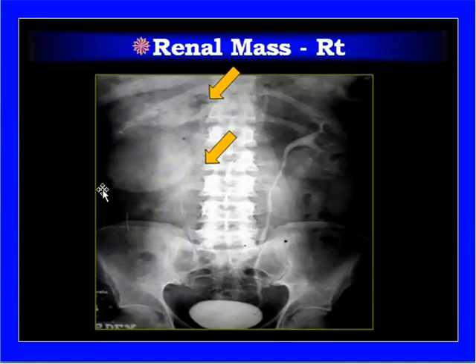Renal mass, intravenous urography has been performed. On the left side, you can see the normal pelvic system with the normal ureter. Urinary bladder is also normal. While you can see a mass on the right side, you can still trace down the right ureter, which means that there is contrast excretion present in the right kidney in spite of the renal mass.